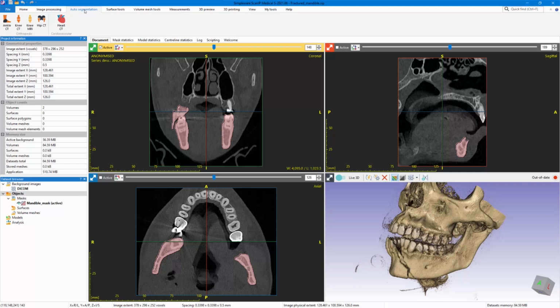As we mentioned, we have AI, machine learned, automated segmentation. Again, this is not part of the clearance, but it gives you a really good starting point on maybe some tricky models. So it's worth considering, and please do get in touch with us for more confirmation on these tools and the regulatory aspects. We have them for ankle, knee, hip CT, knee MRI, and heart CT. And again, there's further information on our website.